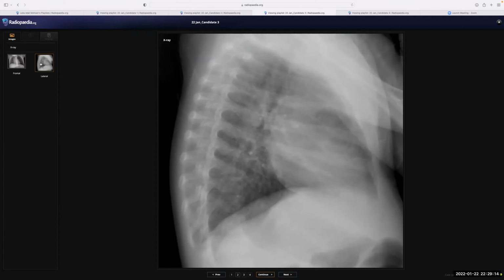So this could be a possibility of obstruction by a mucus plug, specifically if the patient is asthmatic, or even if the foreign body is not radiopaque, maybe it is a seed or nuts. So I should convey all these findings to the referring clinician, because this is also an emergency. The possibility of a foreign body should be managed quickly. So, next case.